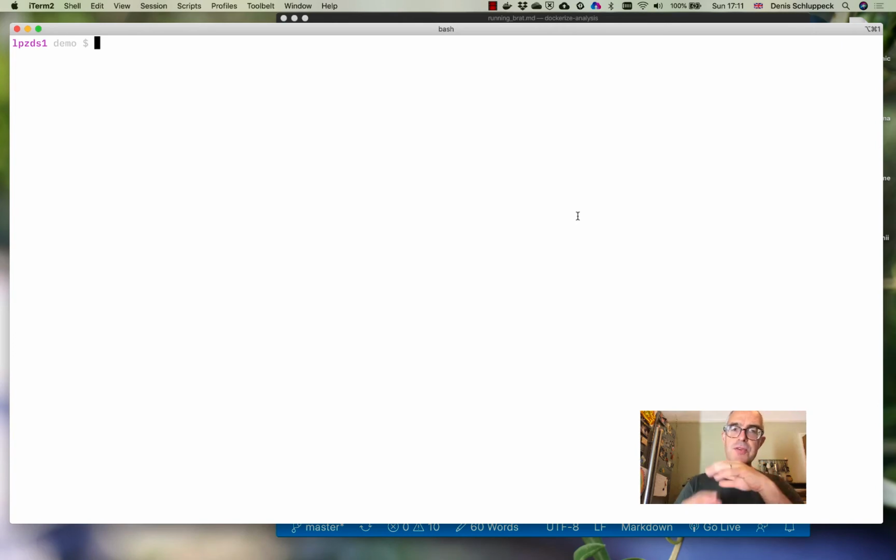In this video, I just want to introduce this idea of using Docker containers to run analysis in an environment where you have everything under control. So I just want to do a couple of quick examples on how this might be useful, and then I want to show you an actual working version of running FSL under Linux on my Mac OS machine, which I got to work.